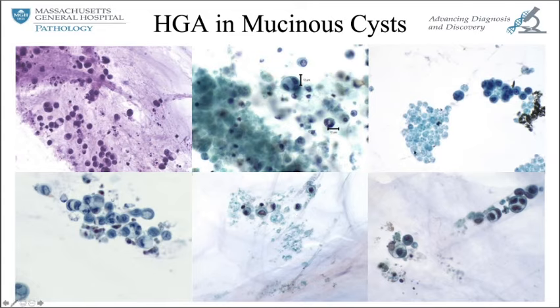If all I had was just degenerative necrosis, I'd be careful. But if I had this necrosis and I had these intact high-grade cells, I would put it in the high-grade category. Again, your comfort as a pathologist in making these classifications is often weighted by quality and quantity. You have a lot more confidence in something like this than you would in something like this, where you just have a few residual cells.